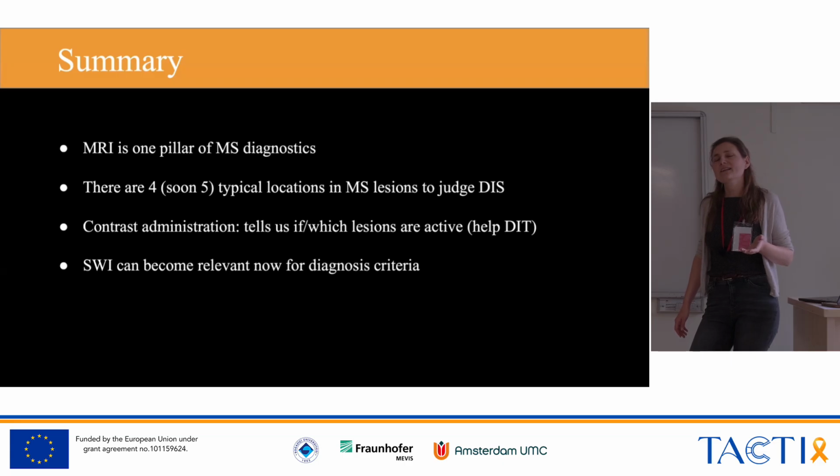So sometimes I'm not so happy that a patient didn't get any contrast, because I already know that 60% of the white matter are in fact sclerotic plaques, just forming a forest of sclerosis, and please try to find the active lesion in there. This is something that we cannot do as humans.